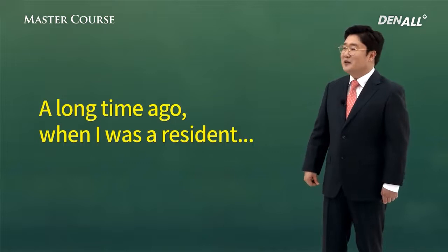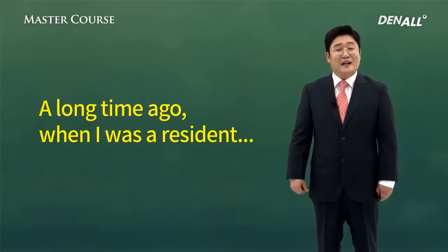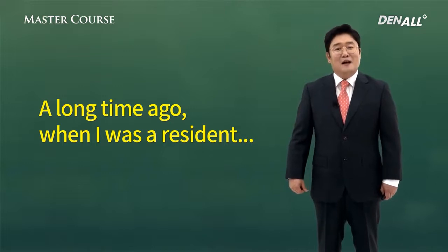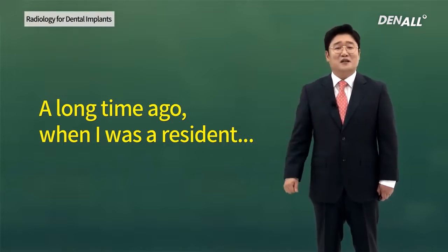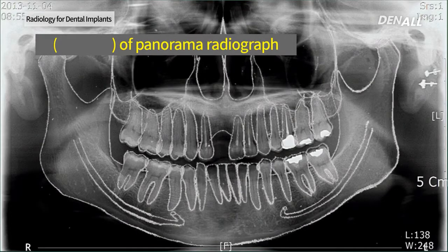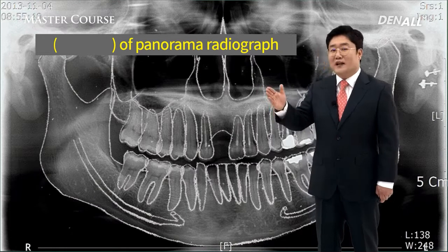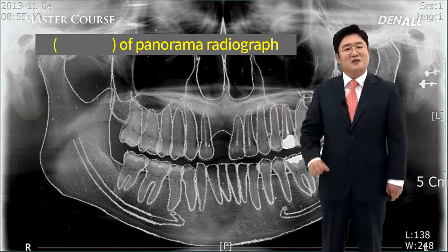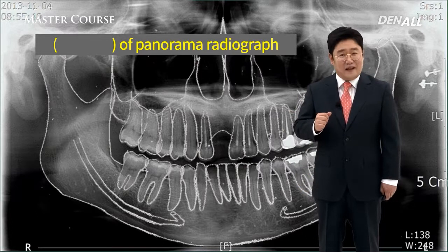A long time ago, when I was a resident in the oral maxillofacial surgery department, I had to do things with the panorama picture. Over the panorama, transparent paper was laid. Teeth and important anatomic structures were indicated and their relationship was identified.